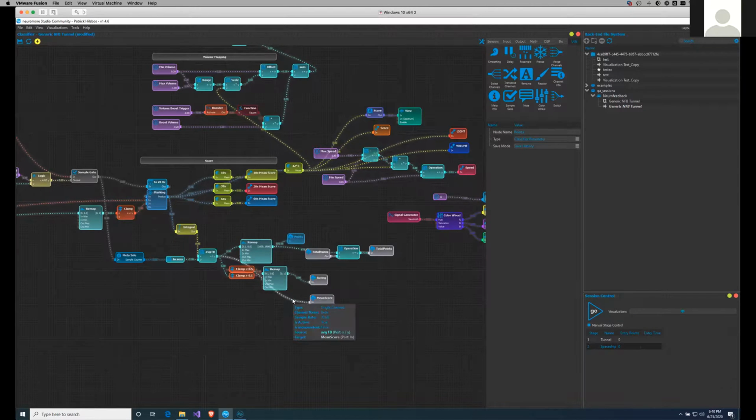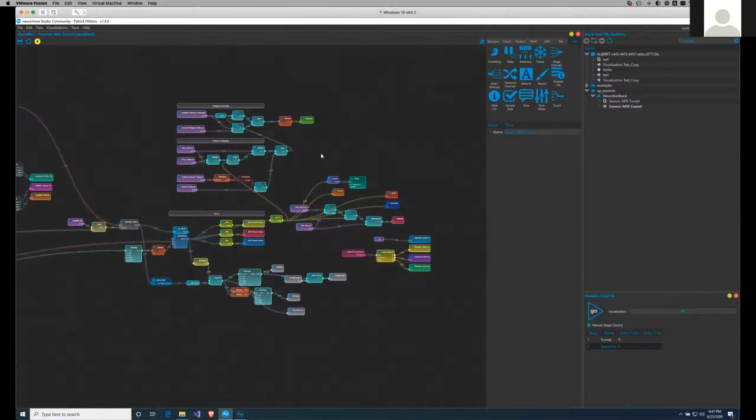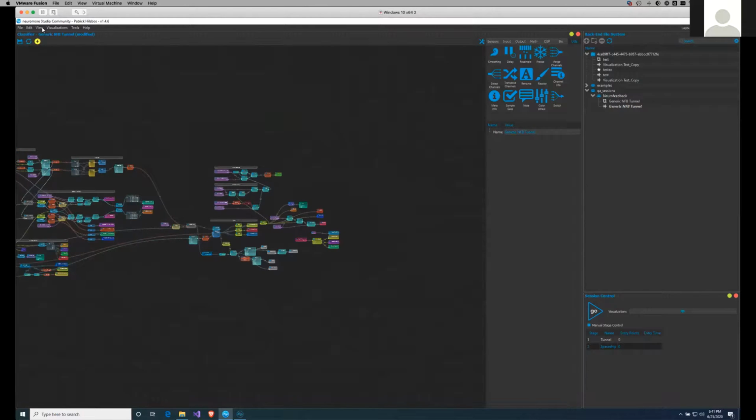The overall intention with that classifier is just to touch base on different aspects that are related to neurofeedback. It's not really meant to be a template for production neurofeedback sessions. We also have different templates for that, so if you're interested in that, please reach out. The overall intention here is to showcase different aspects and give you a playground, so you don't have to figure out how different things can work with each other, how nodes can be connected, and so on. So that's the neurofeedback classifier, or generic neurofeedback classifier.